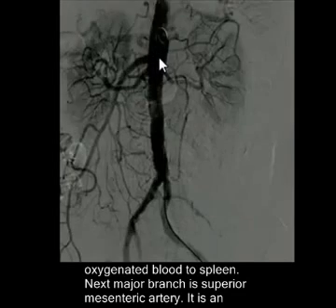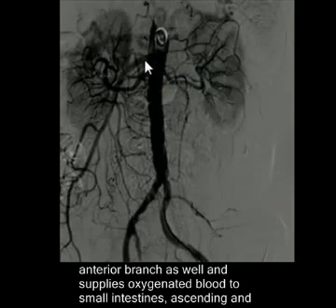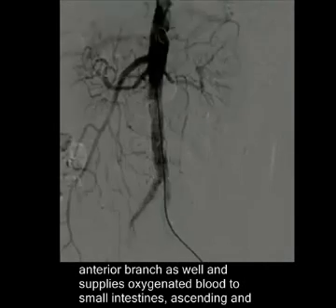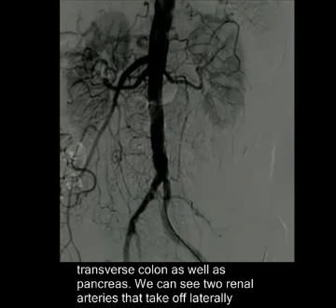The second major artery, which is also an anterior branch and arises anteriorly from the aorta, is the superior mesenteric artery. So this is the superior mesenteric artery, which supplies oxygenated blood to the small intestines, ascending and transverse colon, as well as the pancreas. You can see multiple branches coming out of it.